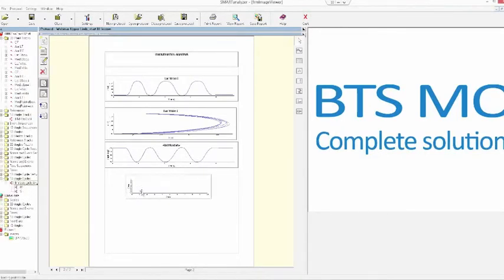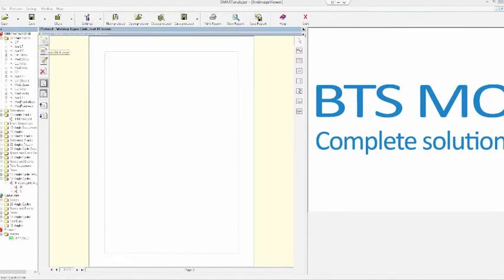Okay, and here I have the mean and the standard deviation. So remember, this was the angle in time, and this was the mean angle between the two defined cycles related to the movement. Okay, so imagine that now we want to also add a legend box. We can choose this option. We can draw a rectangle, and to have the legend, we just have to drag and drop from the name of the trial.